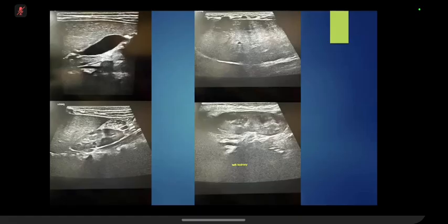What else can we do? Abdominal pain. I will check if there is any other imaging available. I could not appreciate any focal lesion seen. I will try to look at the portal tract to rule out if there is any evidence of any biliary abnormality.